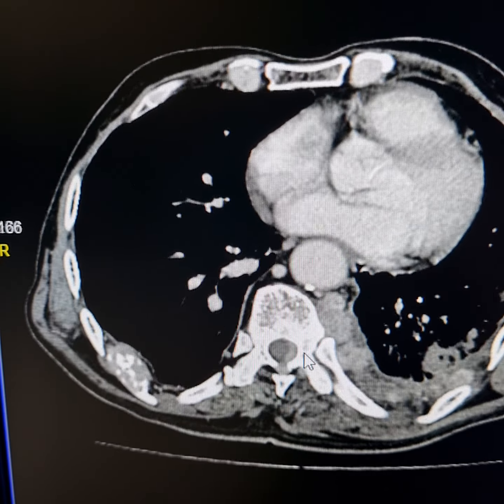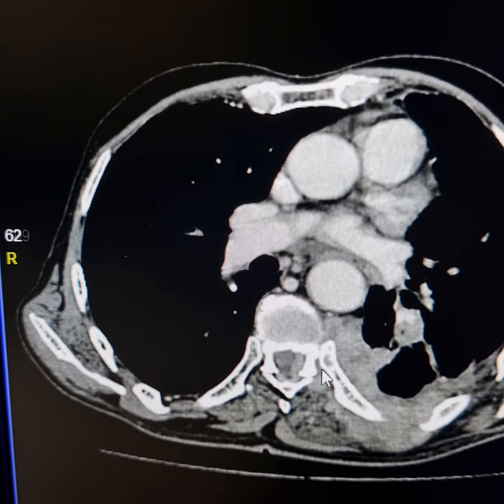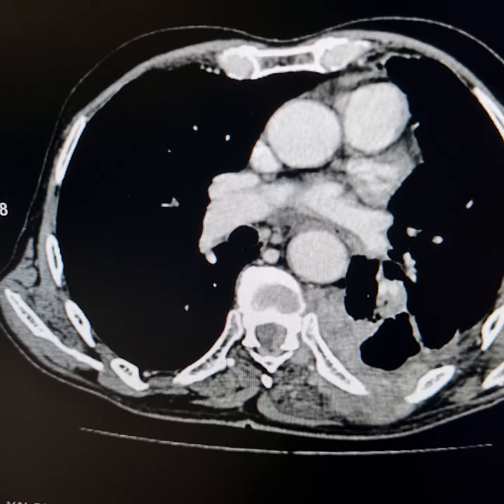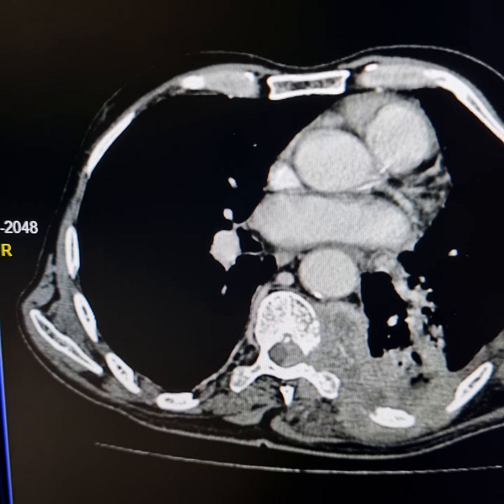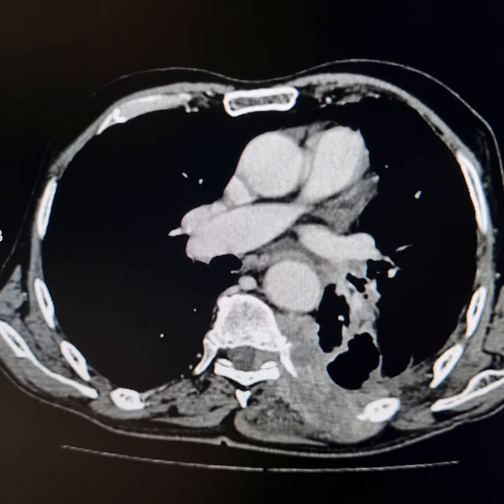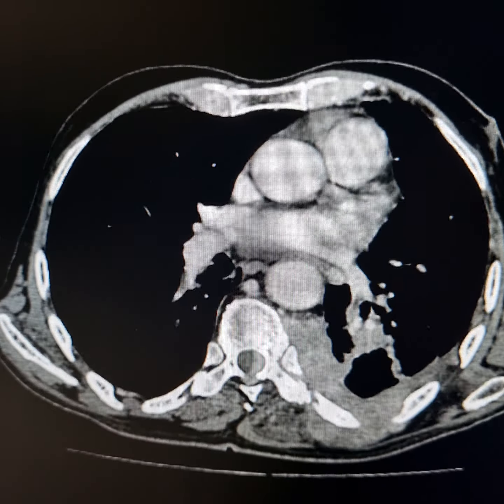Please observe the intraspinal extension through the intervertebral foramina. Now this left transverse process is eroded. The mass has surrounded ribs. The ribs are also eroded in the region of the mass, extending extrathoracically through the intercostal spaces.